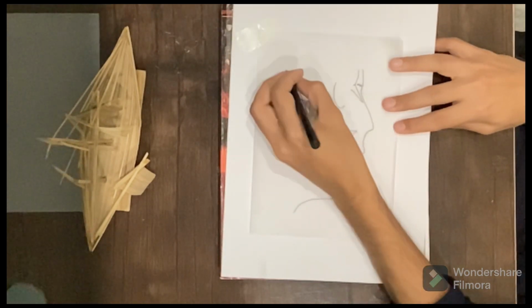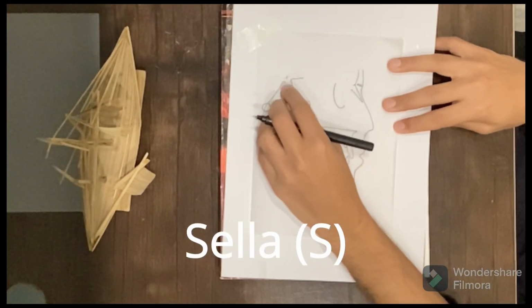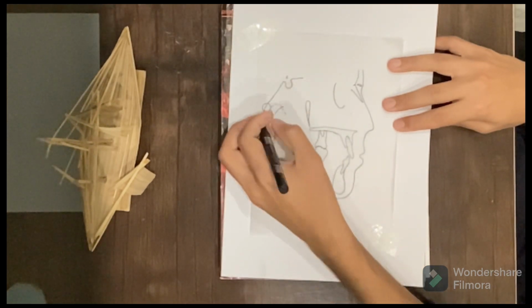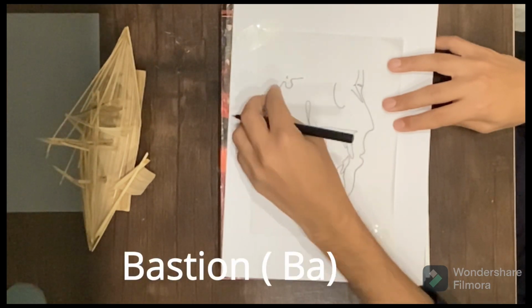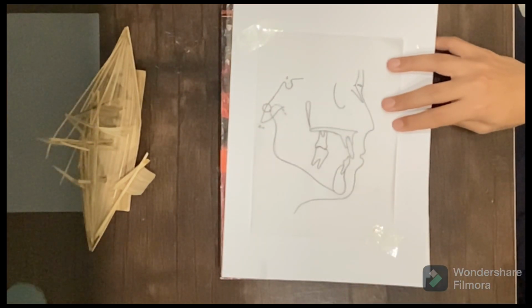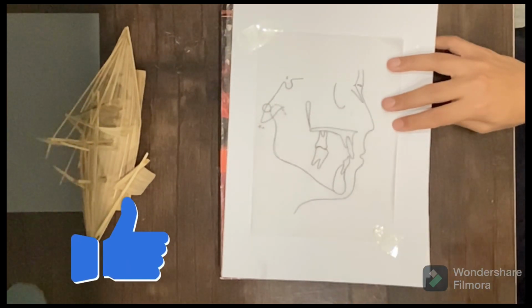The second unilateral point is sella, and sella is basically the imaginary point present at the center of the sella turcica. It is actually the pituitary fossa in which the pituitary gland is present. The third unilateral point is basion. Basion is present at the base of the skull, at the intersection of the superior and inferior borders of the basio-occiput, and its tip is the basion. So this is the basion.